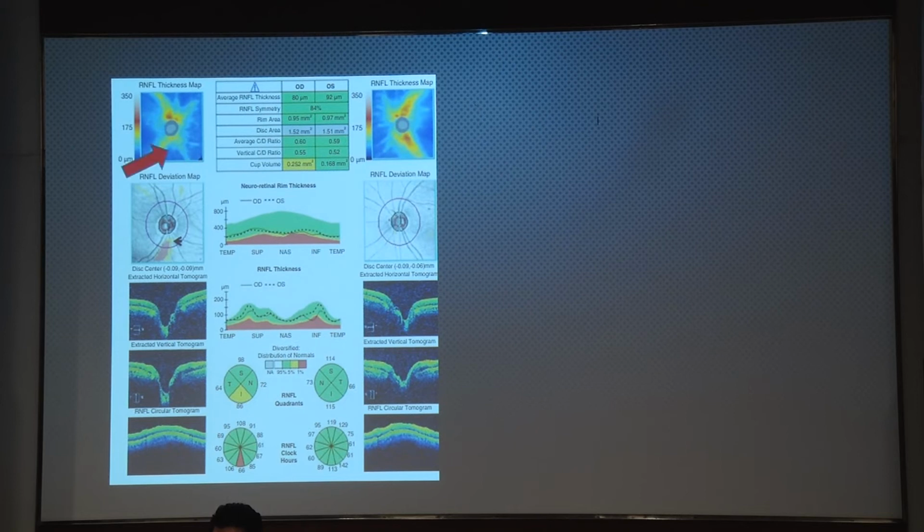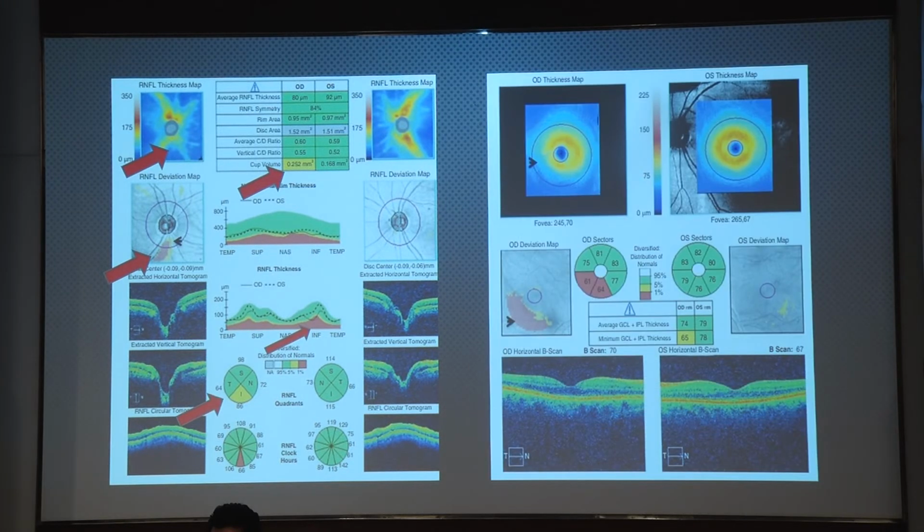But taking an OCT, we can see that there is a thinning noted in the RNFL thickness map and in the deviation map. The key parameters show the values in yellow, which shows that there is a borderline change. And in the TSNIT map, we can see a slight dip in the inferior quadrant. Corresponding OCT macular reports also show thinning in the inferior region.